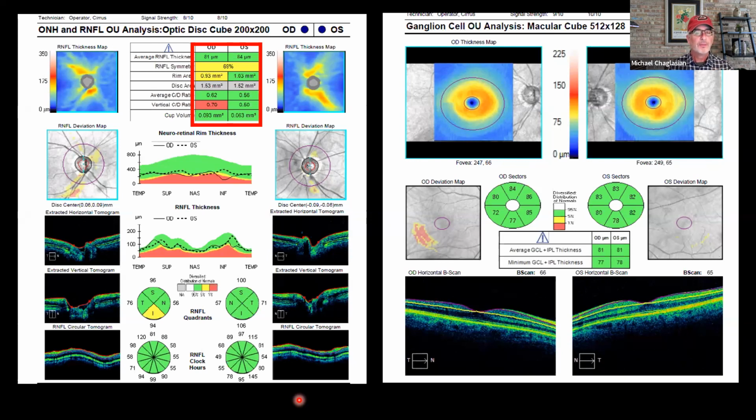So again, my recommendation is examine your workflow in your office and know that I can't analyze an OCT report without having the RNFL and optic disc on one side. And then for the Cirrus, I have a second report here over on the right-hand side, which is the ganglion cell analysis. And I do them side by side. And then also in my device, I'm going to have the photograph and visual field readily accessible so that I can compare that structure function part that I talked about. And then, we'll start to break down looking at each of the key areas.